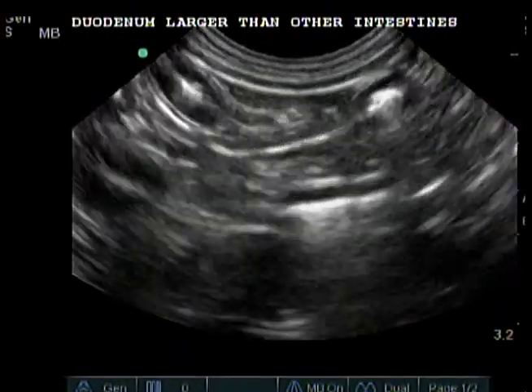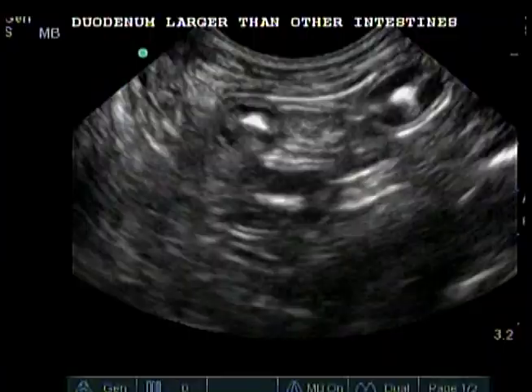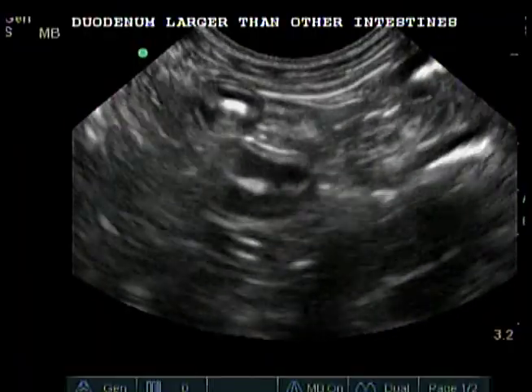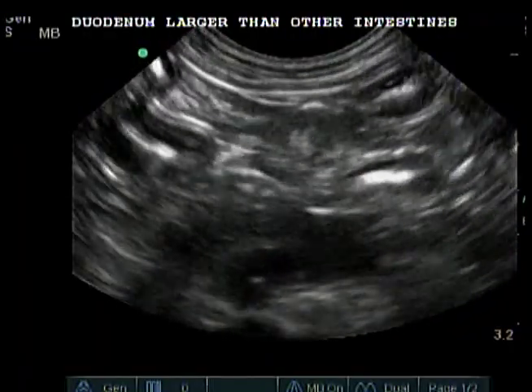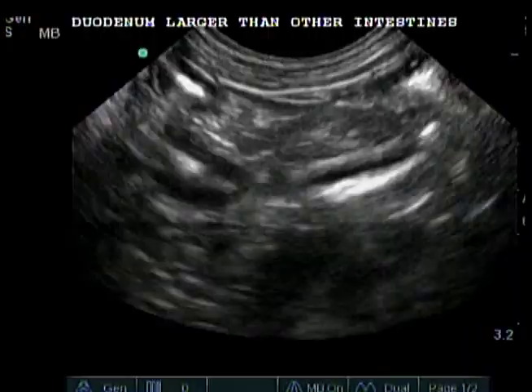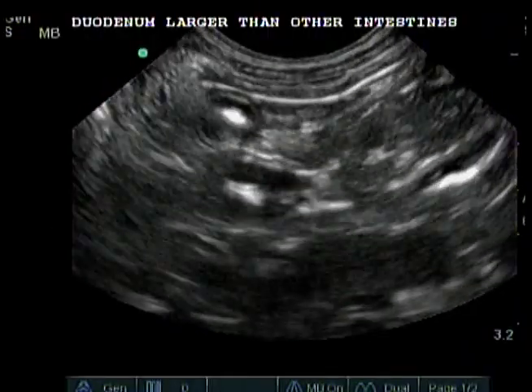In dogs, the transverse and descending duodenum are larger or thicker than the jejunum or ileum. The duodenum is located in the right cranial and right mid-abdomen. All 3 parts of the canine small intestine have the same ultrasound appearance. The duodenum is just larger.